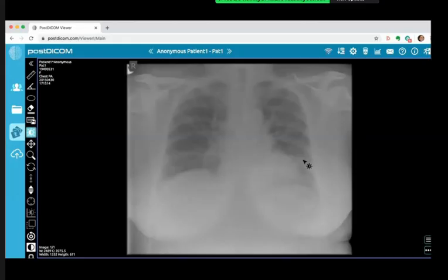Okay. So I think there's slightly more prominent reticulation in the left side. I can't see the right very clearly, but I think similar. And the heart size is unremarkable. I don't think it's enlarged. So to take this case further forward, I'd like to find out if there's previous radiographs and if there's radiation or not, and proceed to a CT. Good.